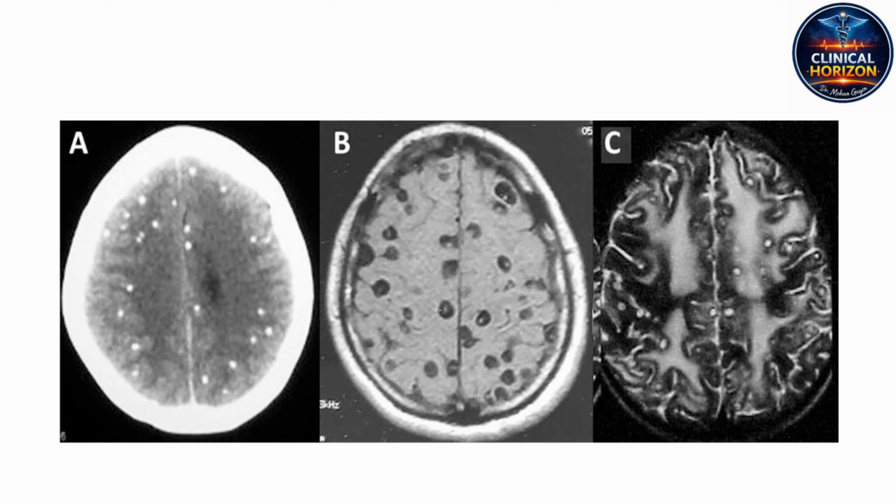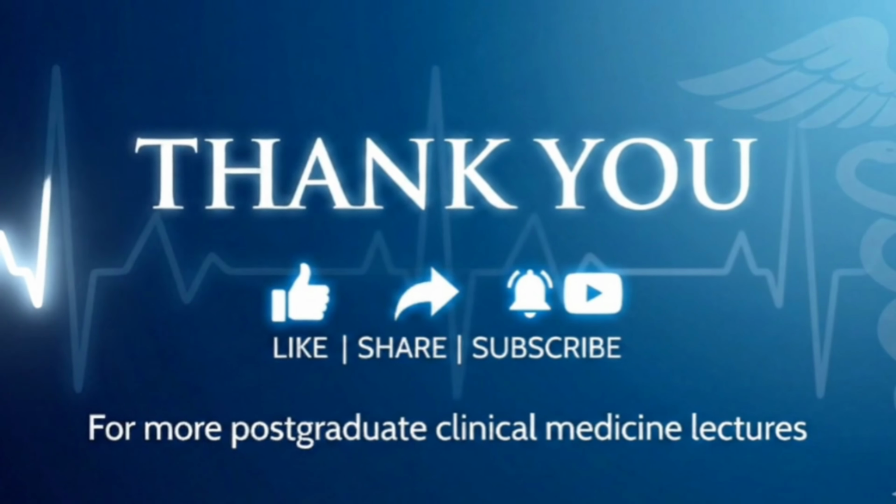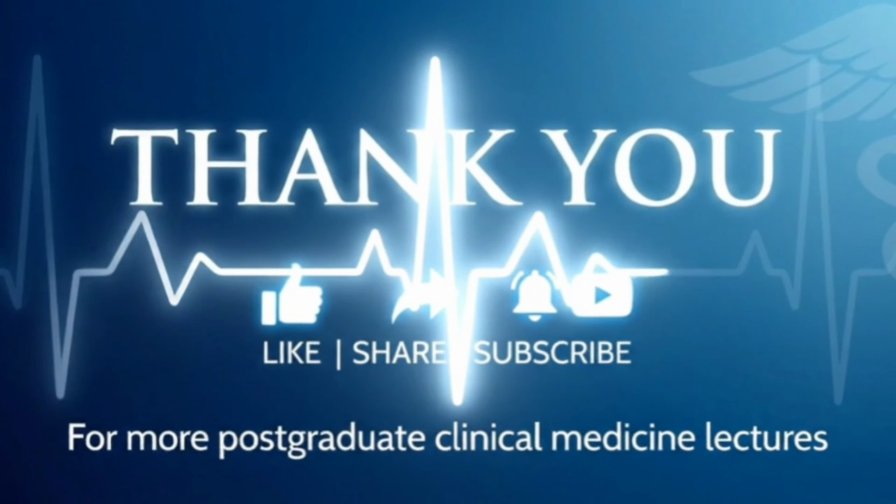Exactly. We contrasted the geometric constraints of high-pressure epidural lenses against the diffuse spread of subdural crescents. We analyzed the brilliant star sign of an acute subarachnoid rupture, and finally traced the life cycle of a parasite written in calcified constellations across the cortex. A full spectrum of neurological emergencies. So what does this all mean? It proves that a grayscale non-contrast image is far more than a simple anatomical snapshot.